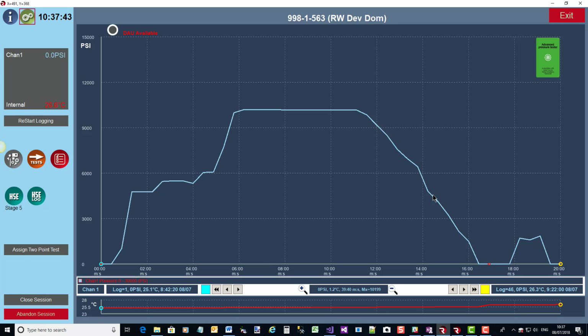And similarly I can do the same for the right click. I can go left one, which takes me to 32, forward to 33, and right to the end. So I can use these navigation controls to move the selected points to where I want on the screen.